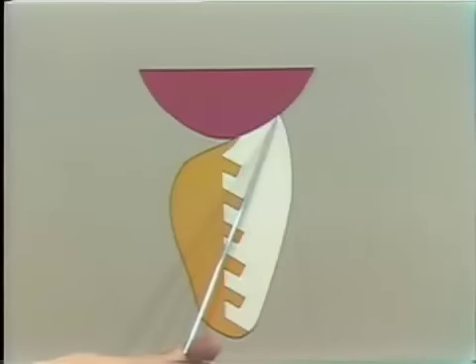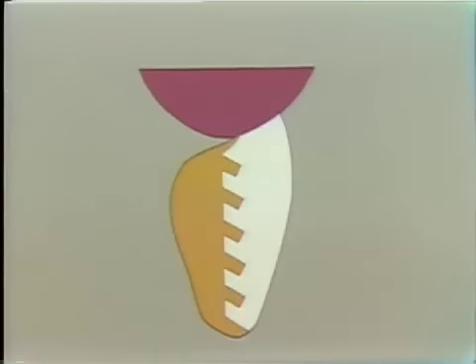And here you see the modified ridge lap to the mucosal surface here. You can see that there are a number of gold pins which extend forward into the porcelain facing. And the technique in using these porcelain facings is to take any denture tooth, grind the lingual surface of it flat, and then with suitable carbide drills, drill in these holes to a depth of a couple of millimeters or so.